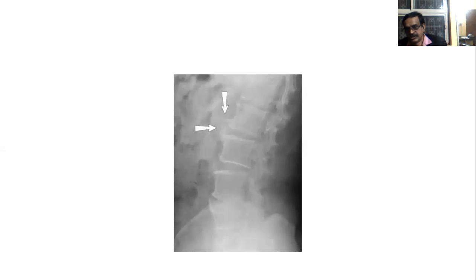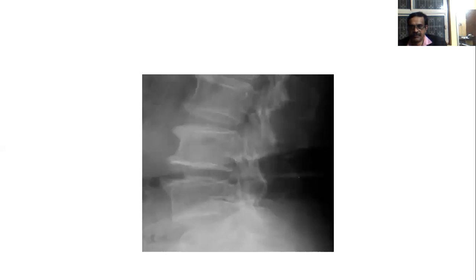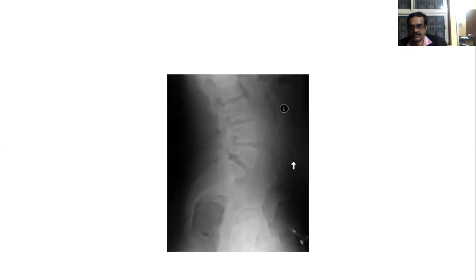This is the lumbar spine. You can see the osteophytes. The arrow mark shows osteophytosis. In this lumbar spine, you see loss of curvature, reduced joint space and osteophytosis. These are very clear. Here you see the L4 and L5. You can see osteophytes and subchondral sclerosis.